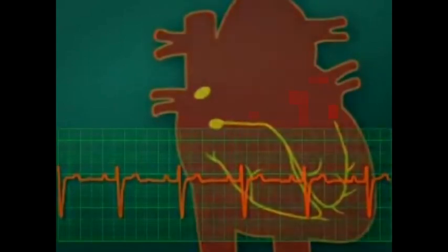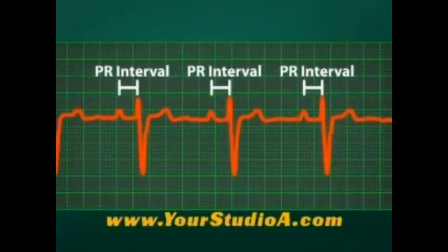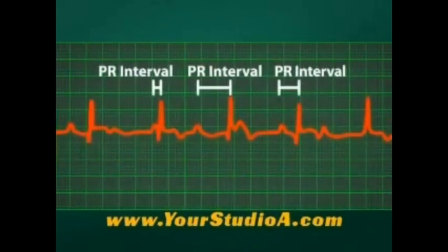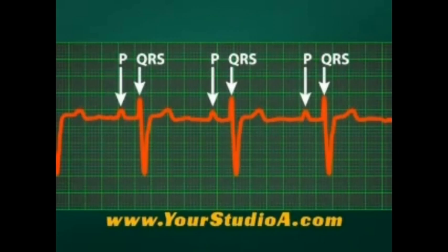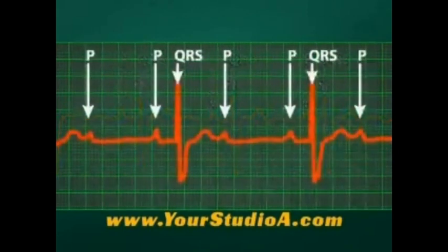block type. First, look at the strip and determine if the PR intervals are constant or varying. If the PR interval is constant, it must be a first degree block or a second degree type 2. If the PR interval is varying, it must be a second degree type 1 or a third degree block. If the PR interval is constant, now look at the P to QRS ratio. If there are the same number of P's as QRS's, it's a first degree block. If there are more P's than QRS's, it's a second degree type 2.